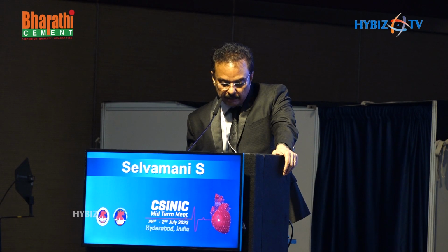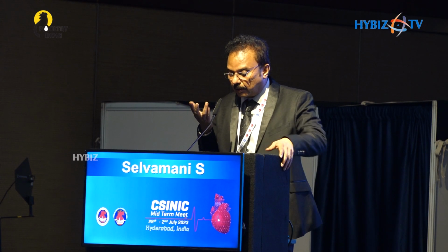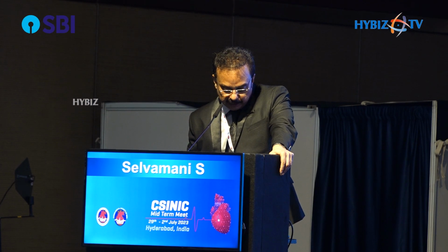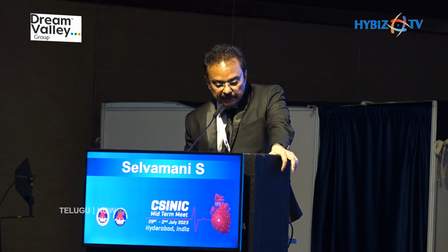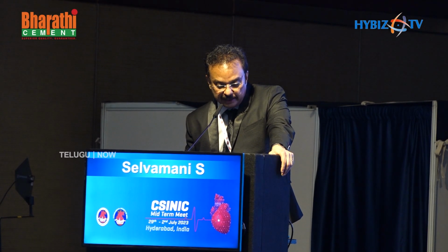So probably this is not a problem with atherosclerosis. You can just imagine what it is. This is the OCT here, and it's basically a polymer hypersensitivity. This is what the angio shows, as well as the OCT, very clear ectatic areas.